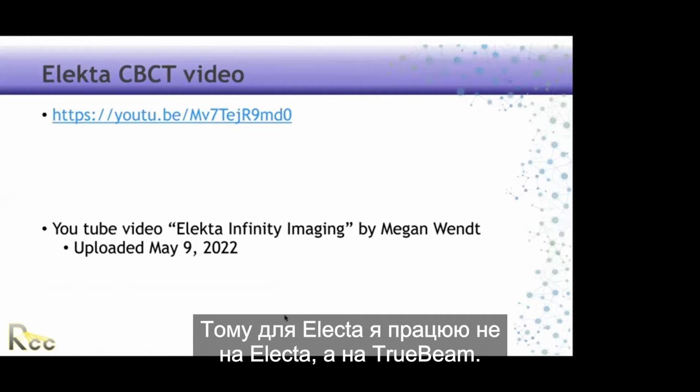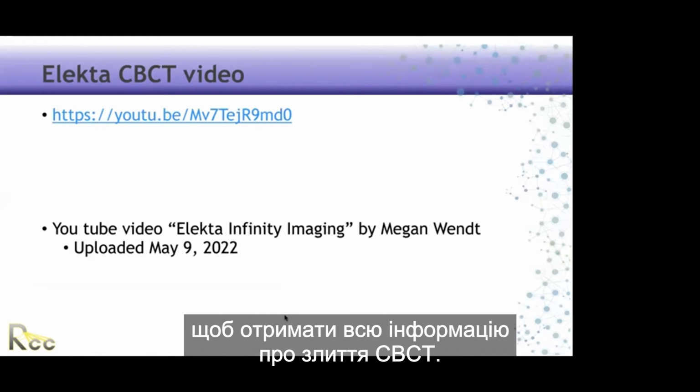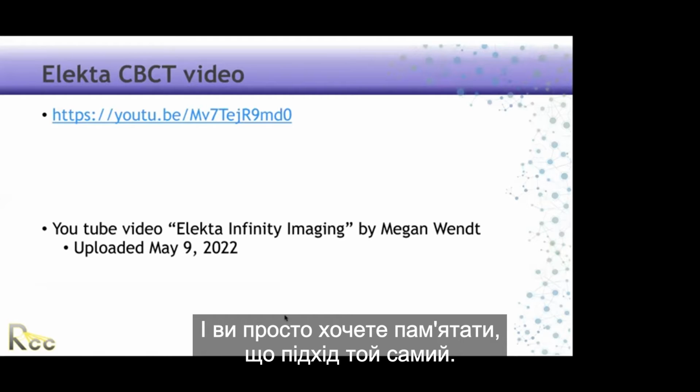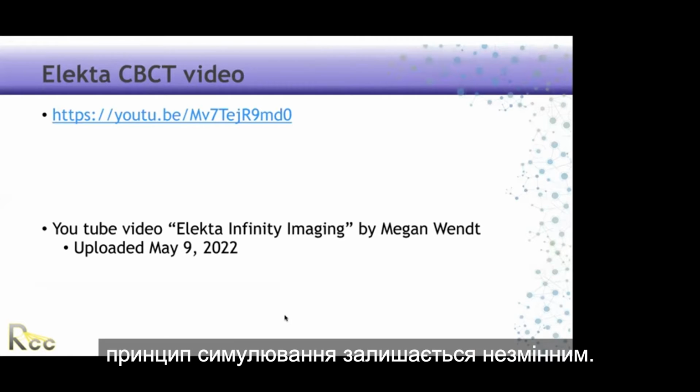So for Elekta, I don't work on Elekta, I work on a TrueBeam. I've done quite a bit of research and reached out to as many therapists as I could to get all the information as far as cone beam matching. And you just want to remember that the approach is the same, even though the software is a little bit different. How we line up a cone beam is the same.